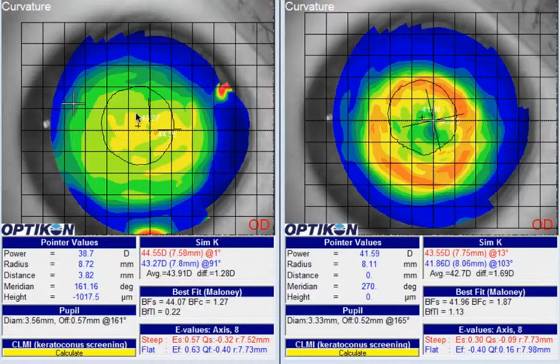So that said, that's not something very easy to do. Oftentimes, best case scenario is we sphericalize the cornea, but in this case, if that occurs, we still have about a diopter and a quarter of against the rule astigmatism that's residual. Looking in the posterior topography, we can see that we're getting more of a spherical treatment, and let's go ahead and bring up the lens.